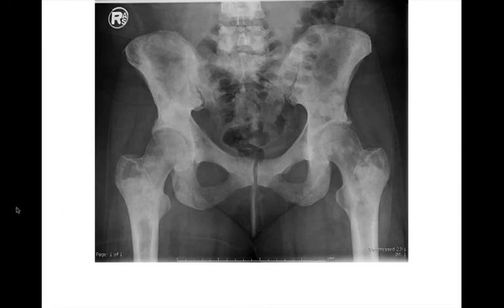Frontal radiograph of the pelvis. There's multiple sclerotic lesions, right, all throughout the proximal femur and pelvis. So just diffuse sclerotic lesions. So what are we going to think of? Diffuse sclerotic lesions, most common would be diffuse blastic metastasis, and of those, breast and prostate are the most common. So this was diffuse prostate metastasis.